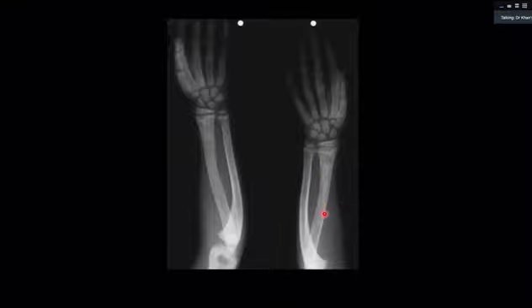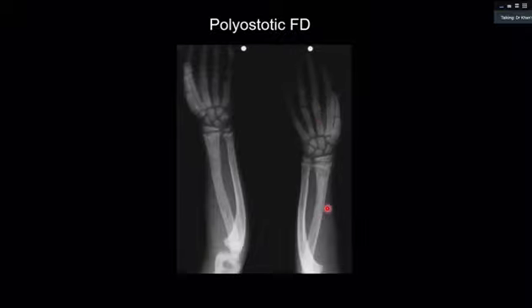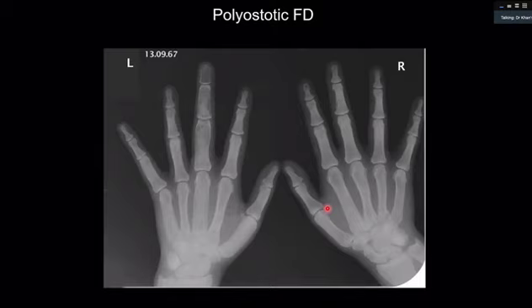Look at this limb, everything is abnormal. Everything is abnormal. And then you see a bit of ground glass, etc. This is one example. And this one is another very good example. I showed you this phalanx as a cropped image, but you can see this ground glass, ground glass, ground glass.